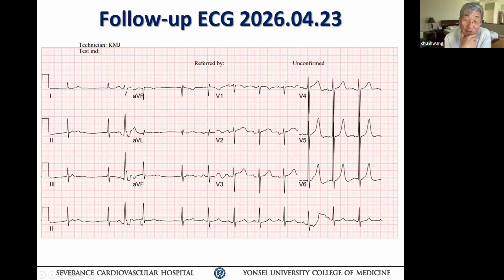So I do not know whether your argument is that sometimes the P wave is so small and scarred that you cannot see it. It is possible, but very unlikely, because you can see so many different varieties of P wave axis, so you still see there's some activity. So I think probably the junctional rhythm, in view of a patient with sick sinus syndrome, most likely. Okay. And as you said, your junctional rhythm may have a slightly different QRS complex, perhaps, but it's not very clear in this tracing here.